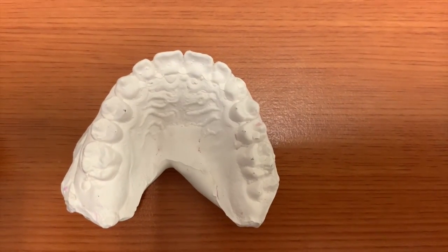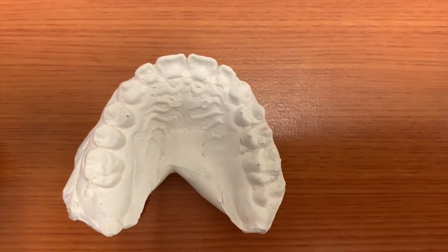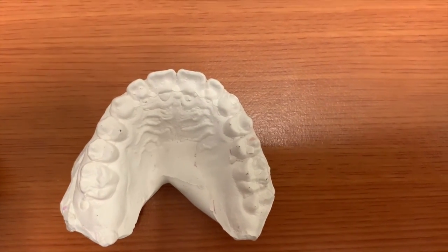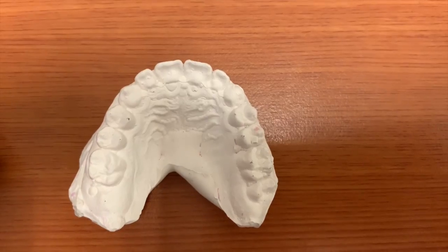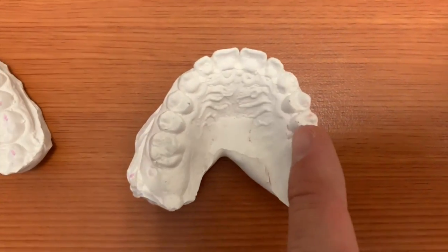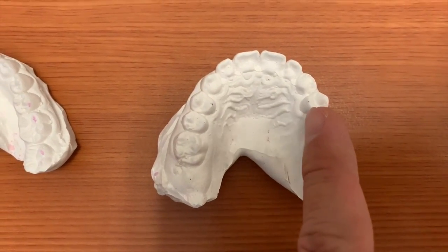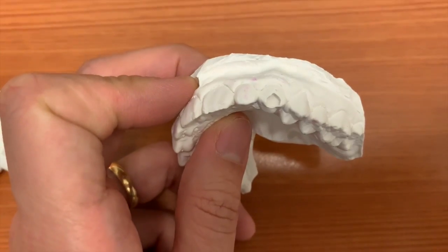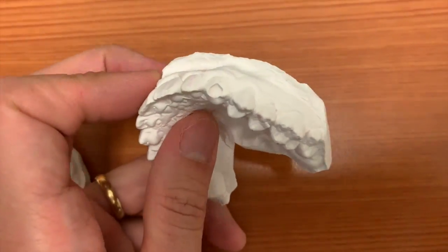So on this side here, you see how we used to take the mold of your teeth when you get your braces off. You will see that this mold which is made has small dots. These are bumps on the teeth here. And you can see even in this case here, there's an area where it doesn't really show up very well in terms of the shape of the teeth.